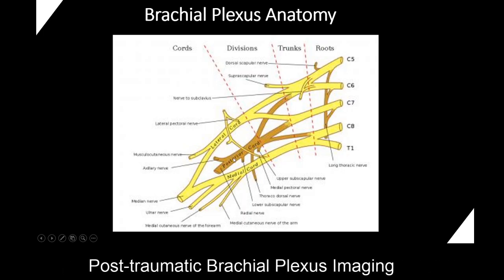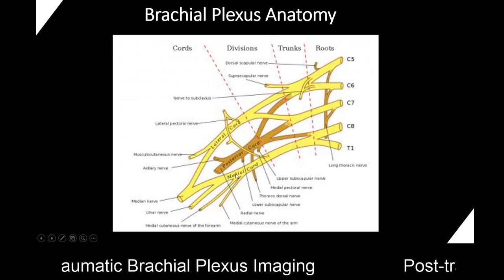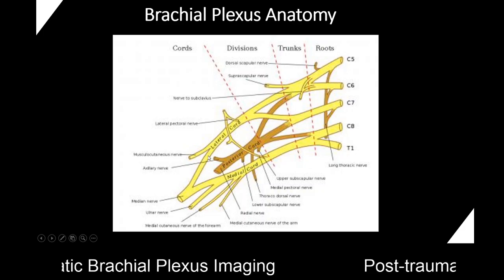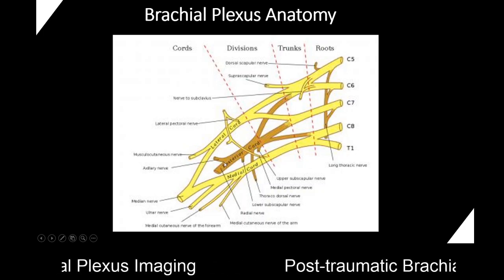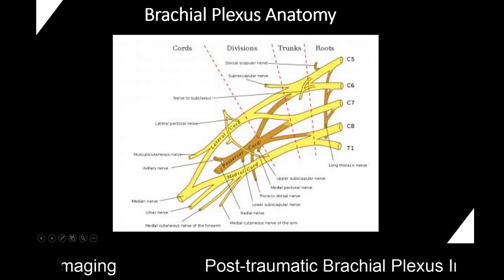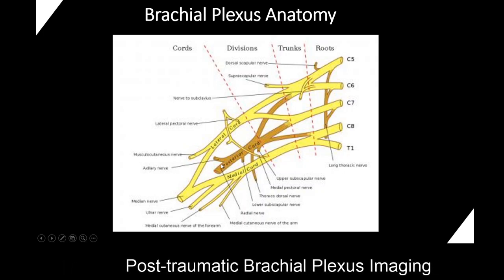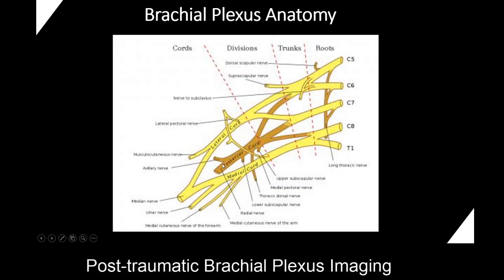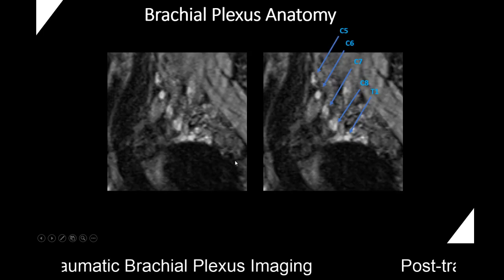And then there is a terminal branch off the medial cord, the ulnar nerve, but off both the medial and lateral cords, there's going to be contributions giving rise to the median nerve. Off the posterior cord, the larger terminal branch is going to be the radial nerve, the smaller one out here, the axillary nerve. So this is to teres minor and deltoid. This to a bunch of the muscles along the dorsal aspect of the arm and forearm, hand and wrist.